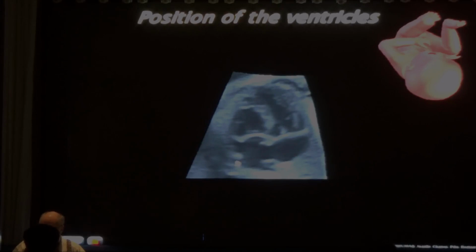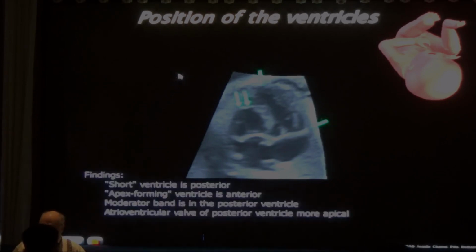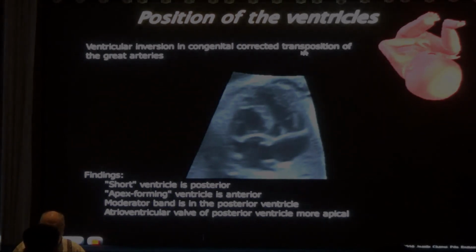This is an atrium that receives the pulmonary veins. So this has to be the left atrium. And the left atrium is connected to the right ventricle. What is this condition? This is the L-transposition of the great arteries. This is what is also called the congenitally corrected transposition of the great arteries. Remember I told you before of the D-transposition, and I may cover this tomorrow also. In the D-transposition, the four-chamber view is normal. It is the outflow tract which is abnormal. In the L-transposition, the four-chamber view is very abnormal, and so is the outflow tract.